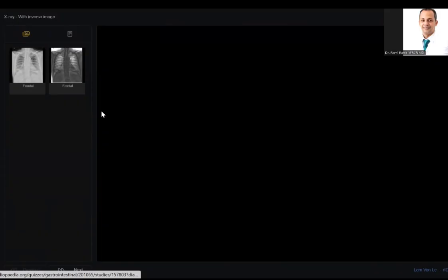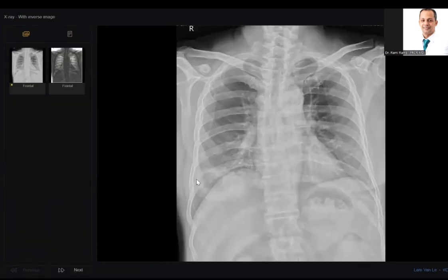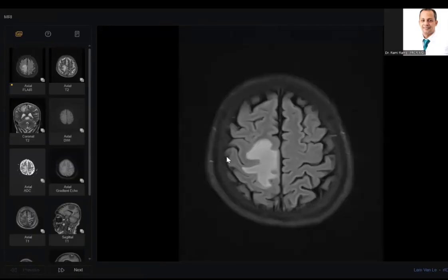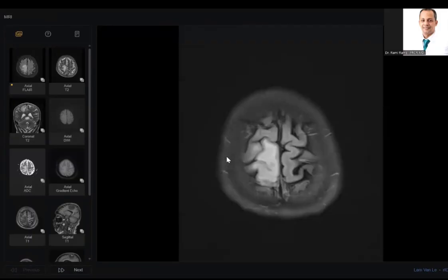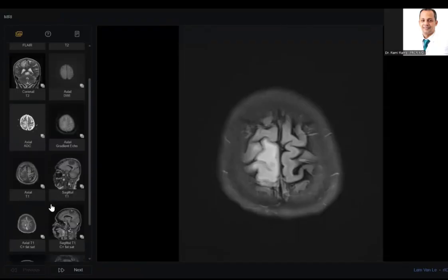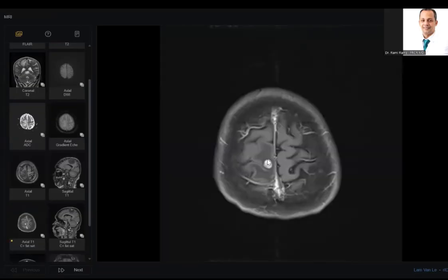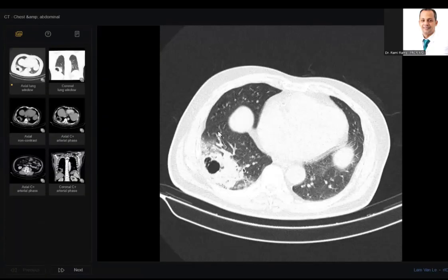The scenario was that it started with this chest X-ray, and there is the cavitating lesion here, and the patient is 70. You were very logical when you talked about mets, and it was a met here. You didn't tell me the exact area. This is the right paramedian centrum semiovale focal space occupying lesion here, markedly enhancing, and it was the CT.